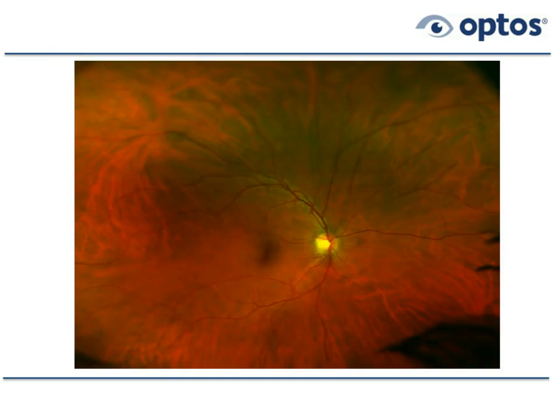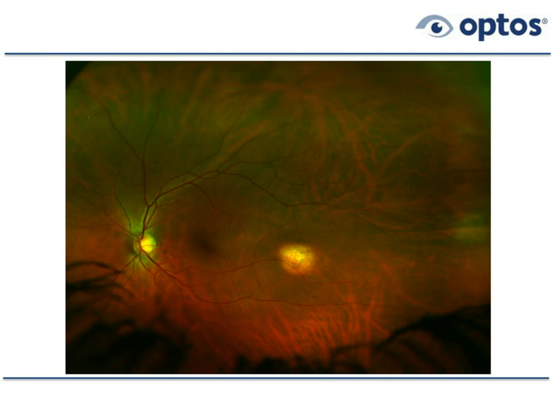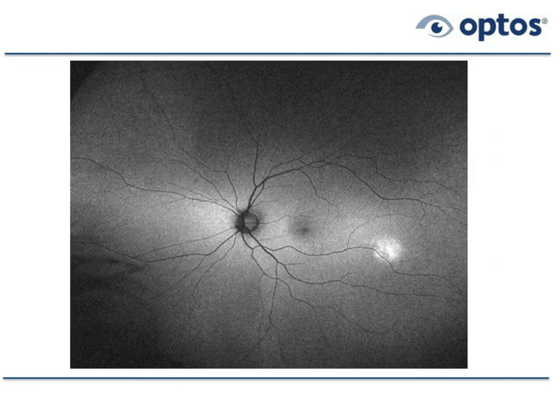Here's the right eye of the same case. It looks fine. Here's the left eye. You can see the lesion, sort of an amelanotic lesion. It's without pigment. And here is the autofluorescence of the same lesion. So autofluorescence is very useful to tell us that this is actually an active lesion, sick RPE, metabolically active, and could be something that we have to be concerned about. So this patient deserves a full workup, if at all possible.